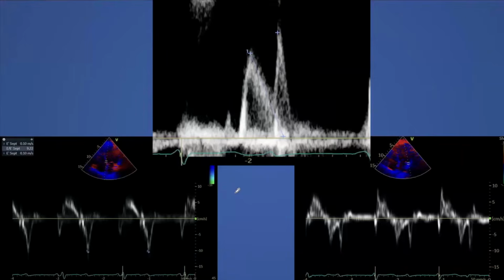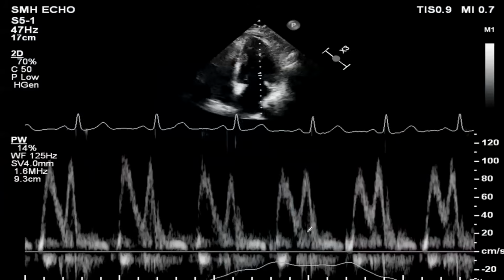And when we go to his Doppler, you can see here there is an A, there is another A, and immediately, this is the medial. Immediately in the lateral, that A disappears and you just have one A. You see? So those patients sometimes can alternate between Mobitz 2 and third degree AV block. How about this one? I think I have just 2 more cases and I'm done.